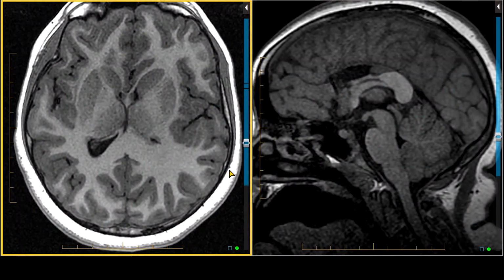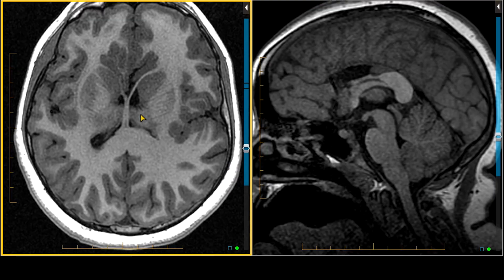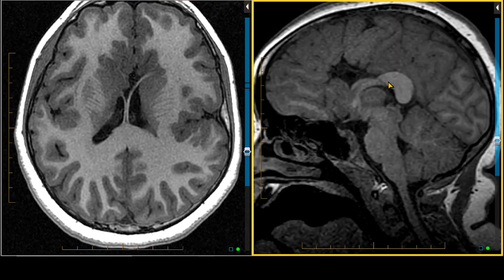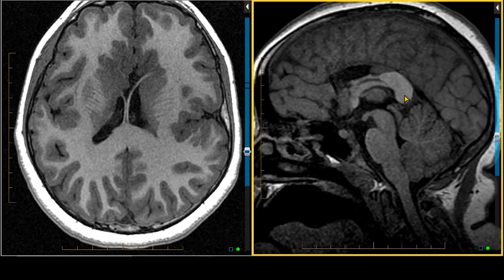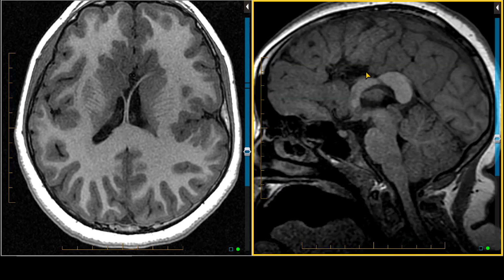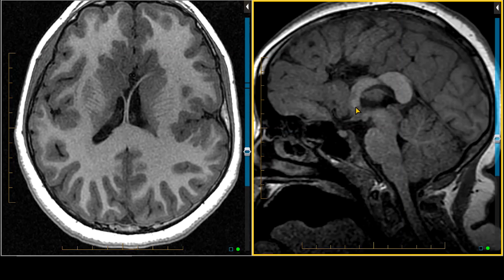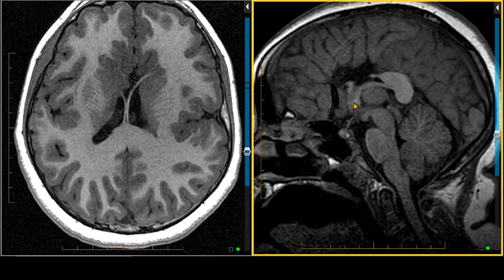This is an MRI scan in an 11-year-old with developmental delay and seizures. As we scroll through, we encounter a number of abnormalities. First, on this sagittal T1 weighted image, we see a thickened splenium and isthmus of the corpus callosum, and we don't see the anterior portions of the corpus callosum. We don't see most of the body, the genu, or the rostrum of the corpus callosum. We see a somewhat thickened anterior commissure.